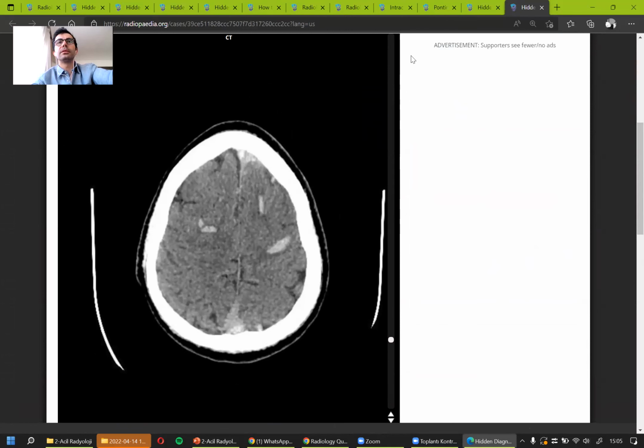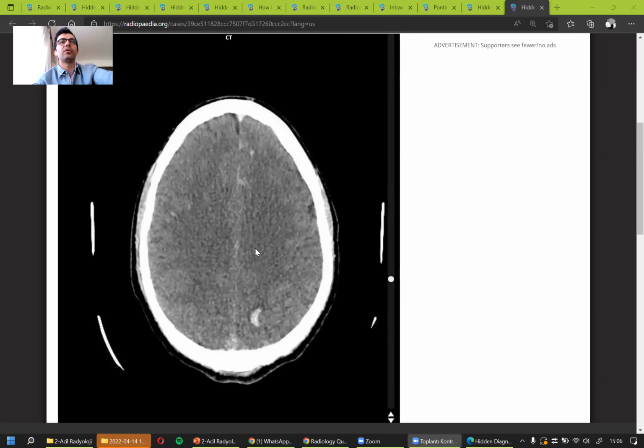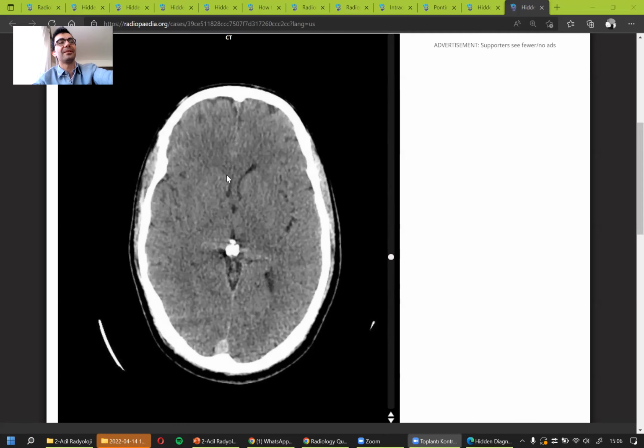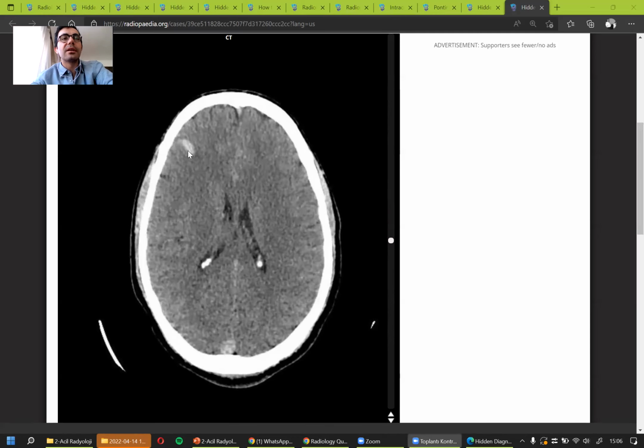I think it's here. This time I'm seeing it on the upper brain, right? But it is pretty much disseminated. Like it's here, here, here. These are all bleeding areas. Also, when I look at the lower parts, I'm seeing some stuff on the deeper brain, some stuff closing to the corticomedullary junction. White, I'm sorry, like subcortical areas.